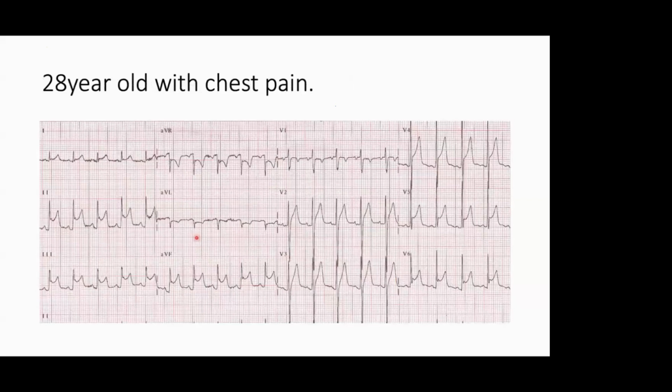This one, anyone try this one? This is another interesting ECG. Till now we have seen anterior myocardial infarction evolving, at 30 minutes, 2 hours, 3 hours, like that. Now, can anyone tell what the findings are in this ECG and what the diagnosis is? How will you differentiate? And see all the 5 points I told you to diagnose the STEMI in this patient.